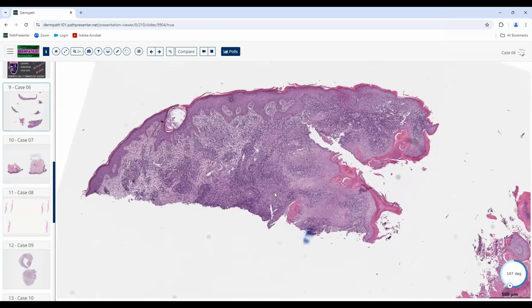Yeah, they thought this was cancer. They really and truly did. In the real world, they thought it was cancer. Do you think it's cancer? No, but it crossed my mind. I thought, yeah, maybe. You can say there's always epithelium up here. So what made you kind of get out of the cancer category?